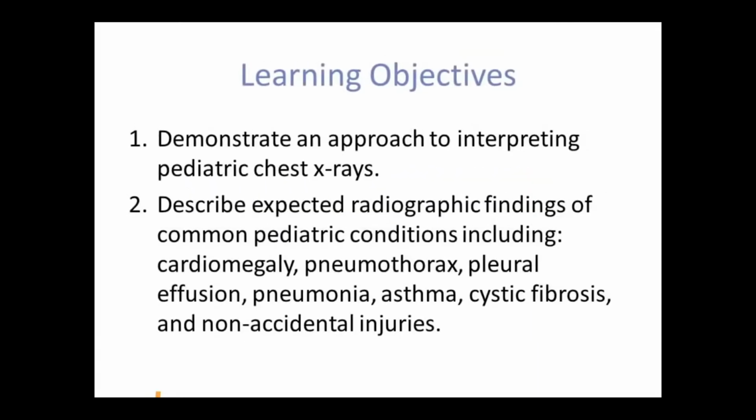The approach that will be explored in this video is that of a top-to-bottom approach. We will begin by looking at the thymus, followed by the mediastinum, heart, lung fields, diaphragm, and end off with looking at the bony structures.